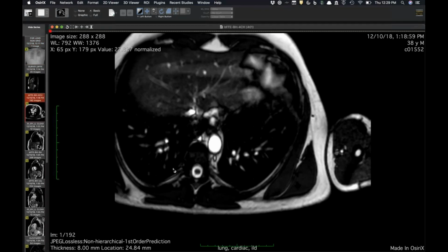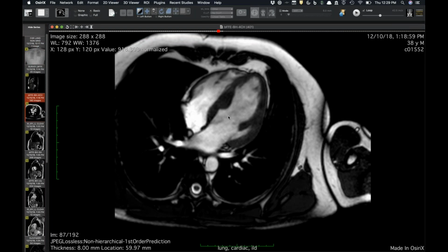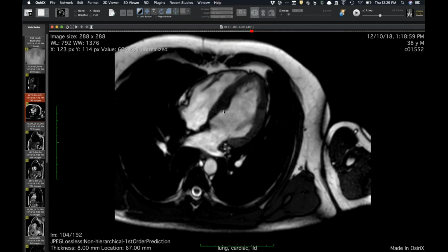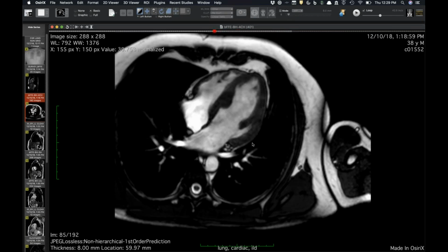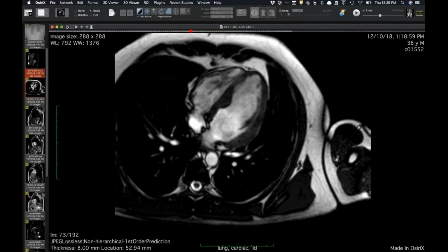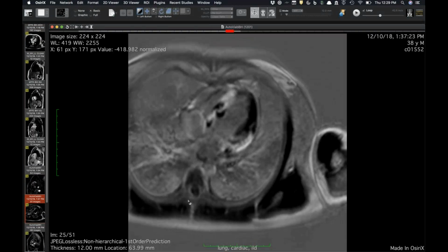And I'll start with the MR, because this is the order that things went in. You see he's got what looks like just a septal knuckle or sigmoid septum at first. It's a little asymmetric, so you think maybe asymmetric hypertrophic cardiomyopathy, but he's got just some funky motion elsewhere and some areas that are a little bit thinned. I'm going to skip right to the delayeds because this is one of the more impressive cases I've ever seen of delayed enhancement in a non-ischemic pattern.